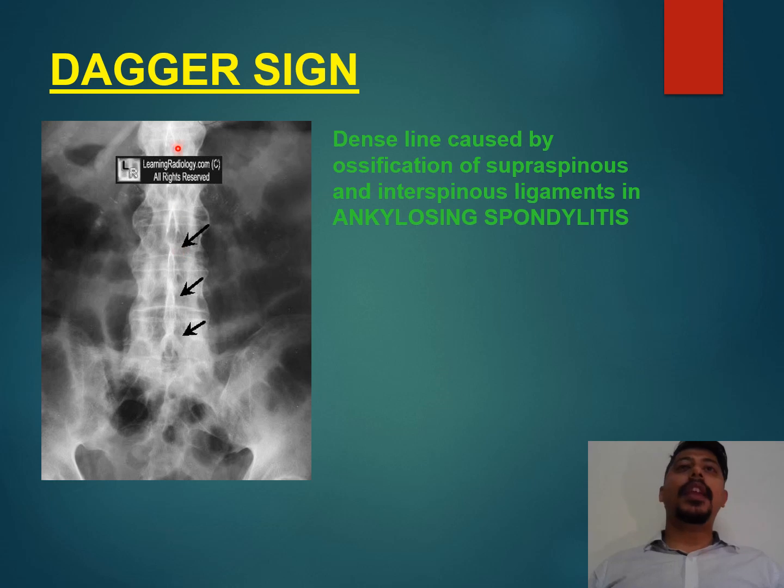Dagger sign, dense line caused by the ossification of supraspinous and interspinous ligaments in ankylosing spondylitis. So this is the dagger sign here.